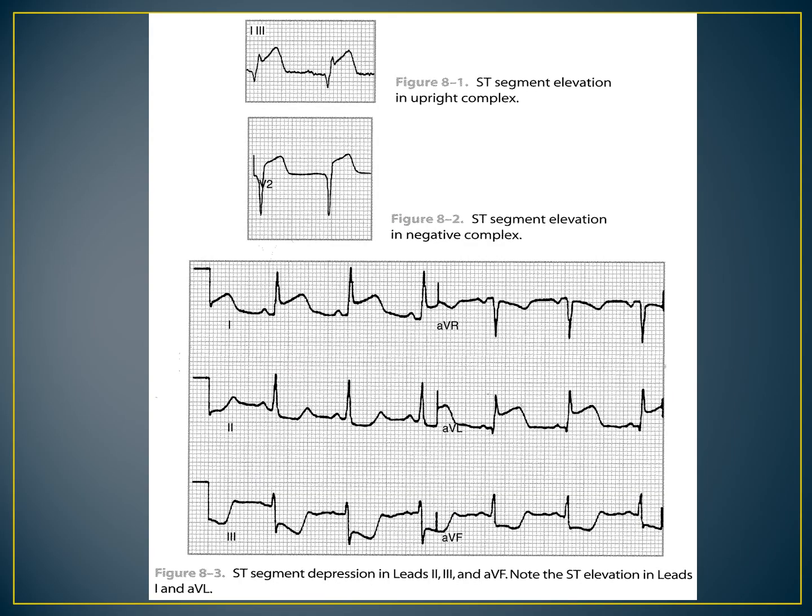In this slide, you can rapidly identify ST elevation in leads 1 and AVL with reciprocal changes, also known as the mirror image, in leads 2, 3, and AVF, which depict ST depression.